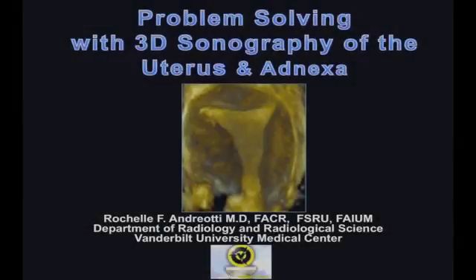In the next 30 minutes, I'd like to have some fun with a series of patient cases demonstrating problem-solving techniques using 3D sonography of the uterus and adnexa.